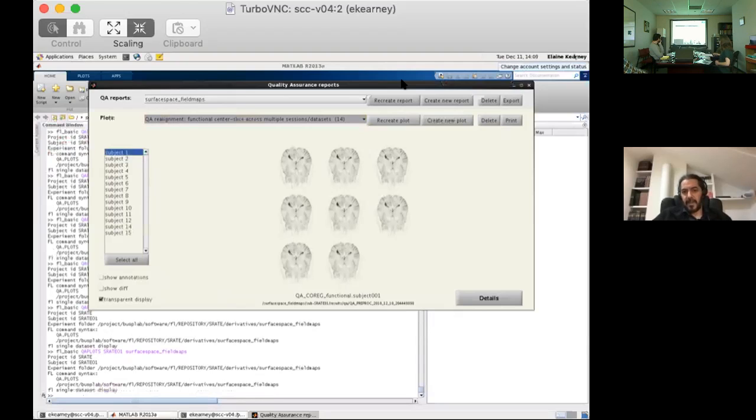Yeah, that's a good point. When we have MNI normalized data, then we are always looking at pretty much the same slice for all of these plots across subjects. But in this pipeline, we don't do any co-registration across subjects. Everything that is co-registered is actually the functional data to the structural data. So we maintain everything in the same orientation as the structural data, just to keep everything in the same orientation that the FreeSurfer surfaces have been generated on. And Jason is exactly right.